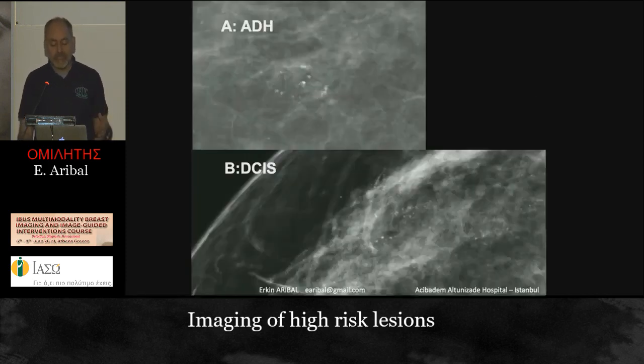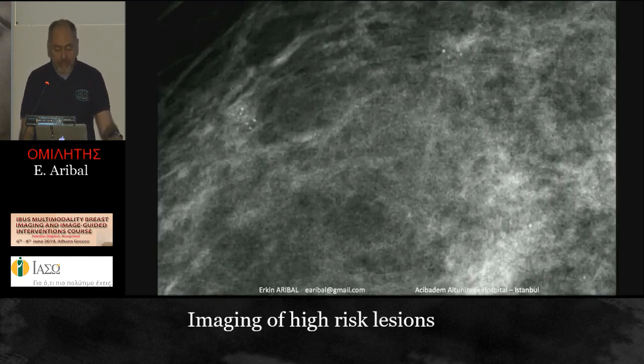So when it's an ADH or DCIS, the imaging does not differ. It's almost the same. There are two cases here. They look similar, but one of them was ADH, even though the excision was made. There was no difference. And the other one is DCIS.